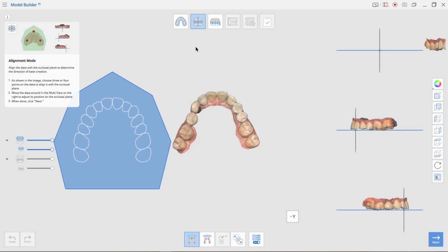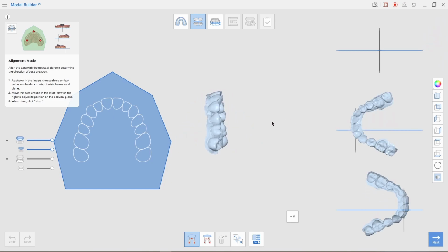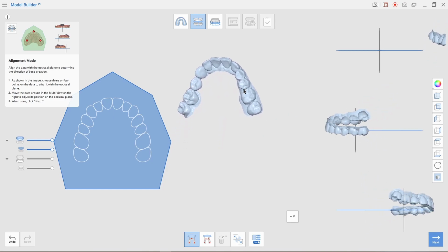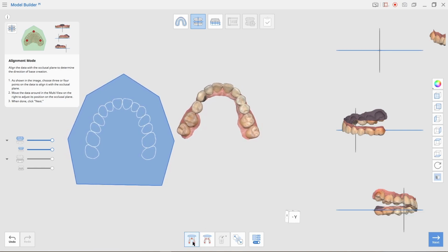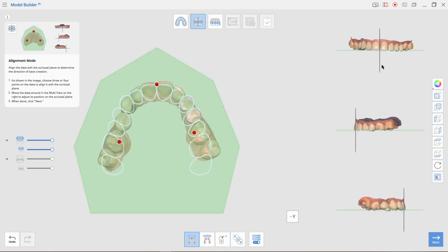Now the model axis includes a couple different ways to do it. Remember, in the Medit system, we have right for rotate, we have middle for translate, and left is just to select things. So let me go ahead and use this little 3-point system here to select our model axis. The 3 points are molar, left click molar, and left click incisor midline. And then more often than not, it will give you an accurate base here.